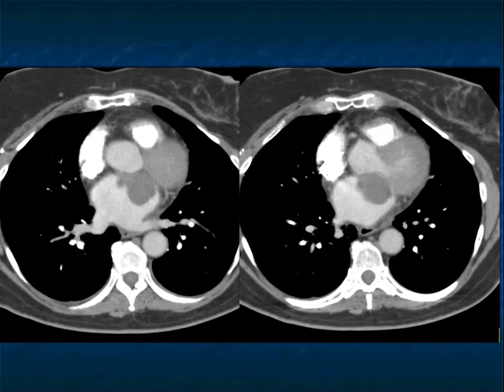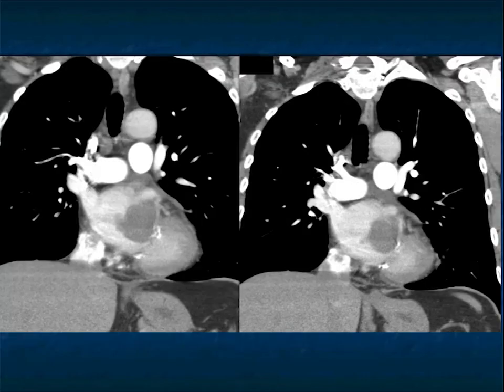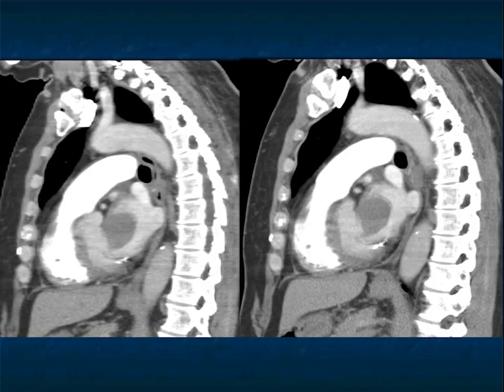Now, I have to admit, it's not the best location for atrial myxoma, right? Well, left atrium is good, but it's sitting in the wrong spot. It's sitting between the atrium and the ventricle by the patient's valve. So in this case, it makes it a bit easier when you're looking at something involving the valve, the mitral valve in this case, to know that it's not going to be an atrial myxoma. But just a really nice example of this case, showing it to you as well in sagittal views.